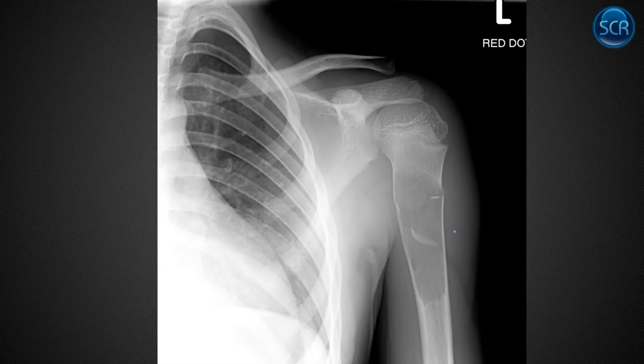They're usually a little expansile. They're centrally located, so they're usually right in the middle, they expand outwards. They're metaphyseal or occasionally a little more diaphyseal. And you can see the cortical offset here, the fracture line propagating around. And the thing that really seals the deal on this, that this isn't fibrous dysplasia or something else, is that they've got these fallen fragments.